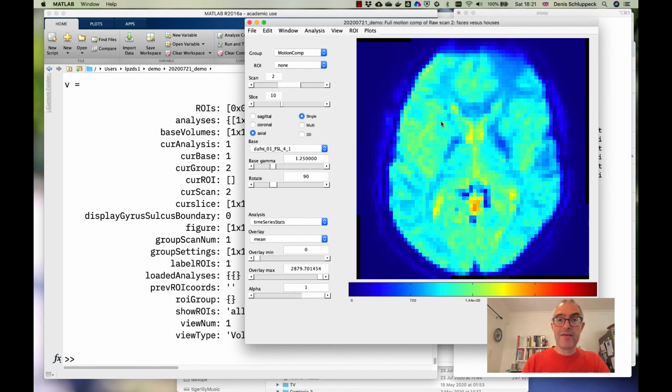If you are mixing scripting and interacting with a GUI, then you have to make sure that the current view is always in sync with what's going on there.